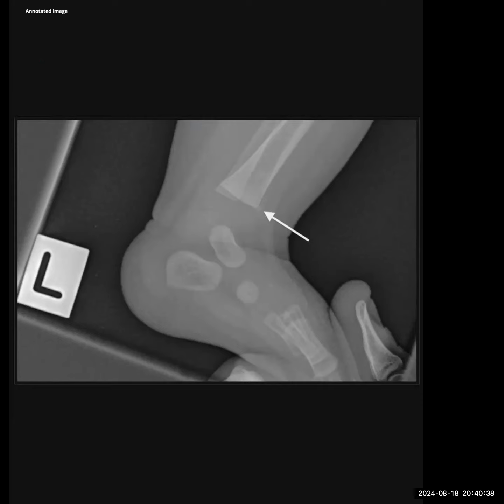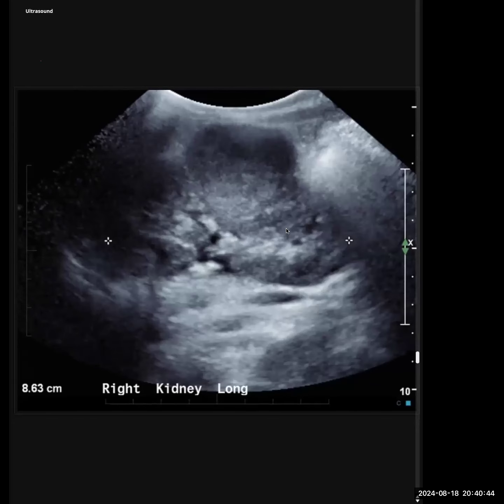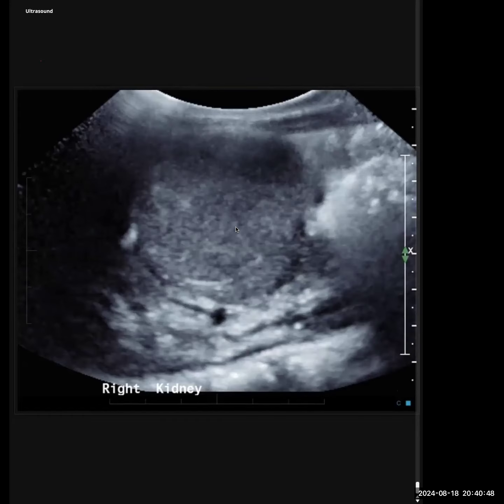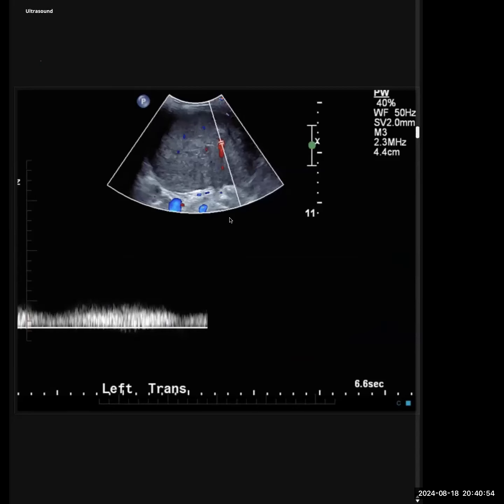I asked you whether you've seen all the images because after the bladder there was also a right-sided kidney mass. So this was actually a case of bilateral Wilms. I guess the biggest learning point in this case is, yes, I know that you were trying to look for vascular invasion, and I agree that's something you have to do.